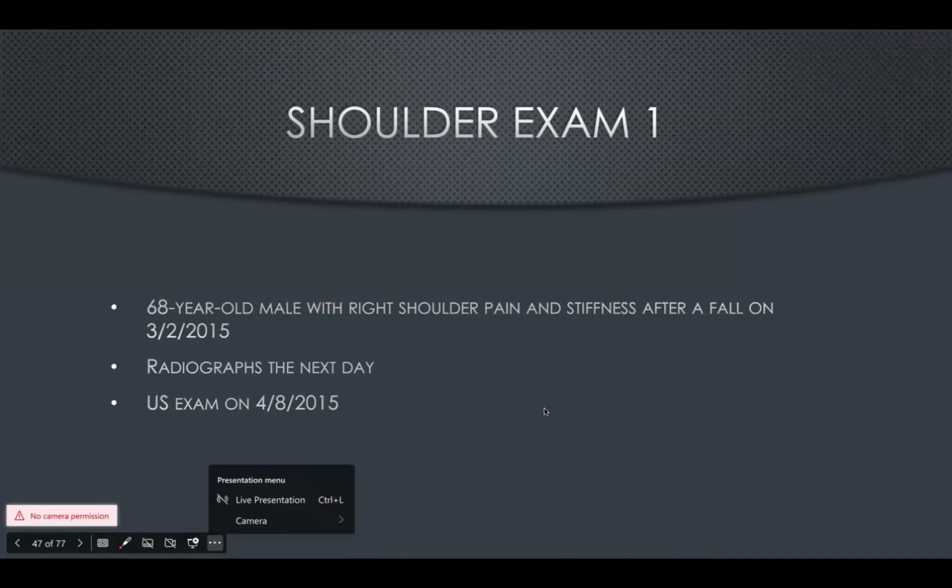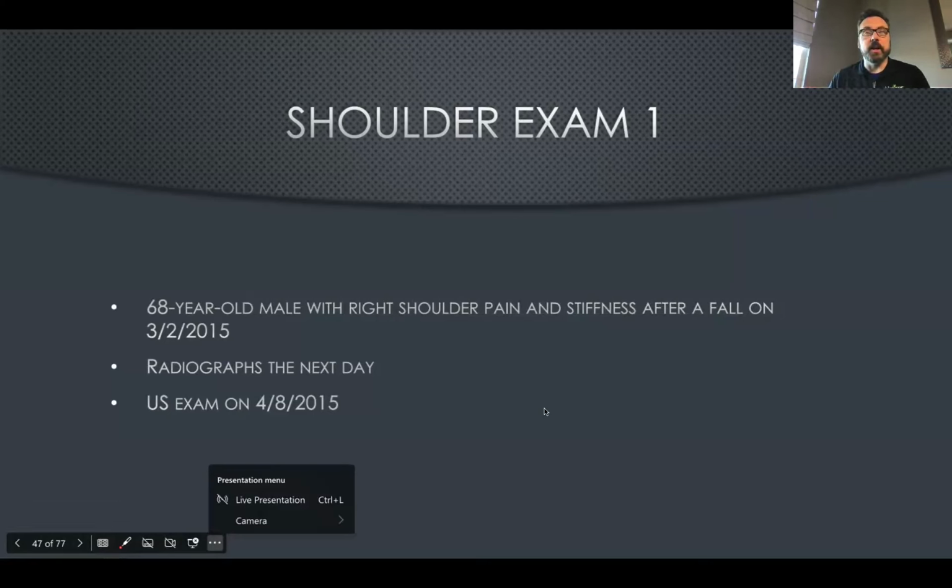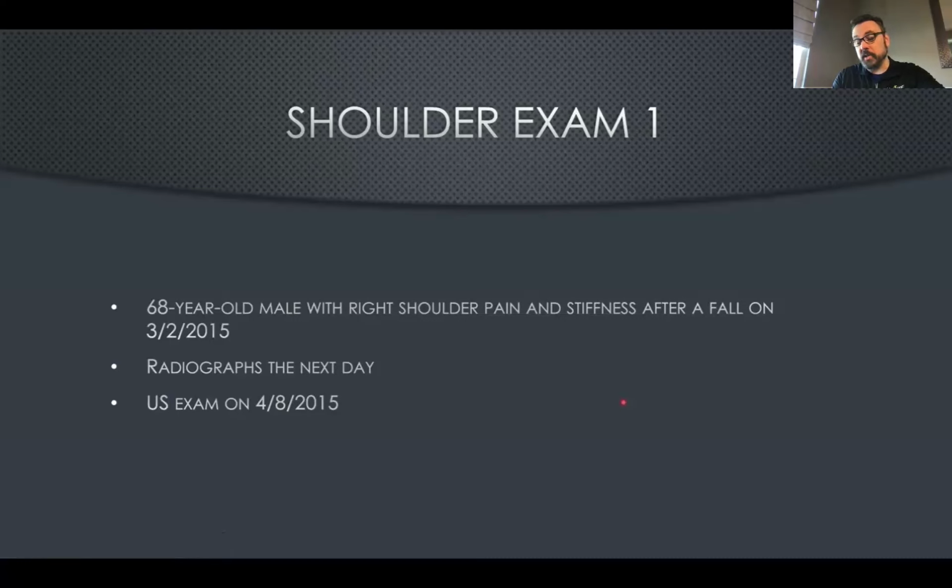Thank you. Awesome. Wonderful. So I have a selection of a couple of cases here that I wanted to share that go through some of the areas where MSK ultrasound was of use in clinical practice. The first one I have here is a shoulder exam. This was a 68-year-old male who had right shoulder pain and stiffness after a fall. They took x-rays the next day, and then he got the ultrasound a while after that.